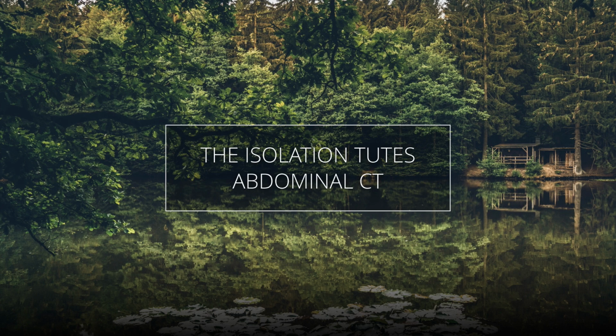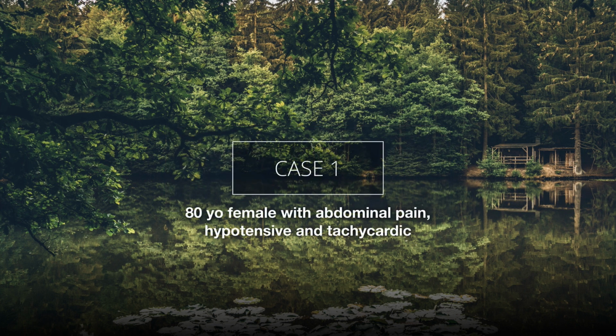So we're continuing with some more abdominal CT cases today. There is a bit of a theme to a few of them, and there's some teaching points that we'll discuss. So the first case is an 80-year-old female, and this is the history that we've been provided.